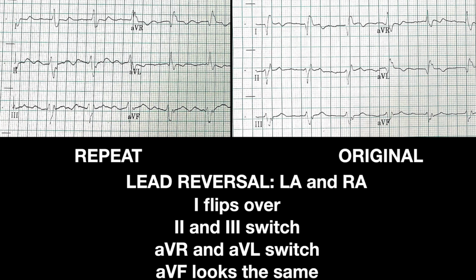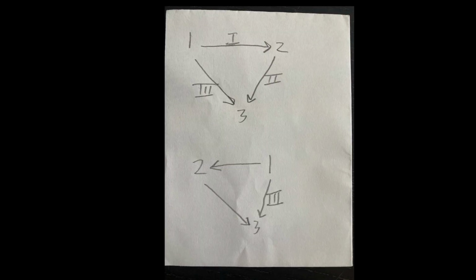And again, you don't have to remember the pattern. If you want to do it at the station afterwards, this is what I did, because I had a minute sitting still in the emergency department when this was handed to me. I sat down and wrote the thing out, and I don't remember the pattern. But the really nice thing is that once you grasp this part, this is really what knowing what an EKG is all about. This is when you've understood it.